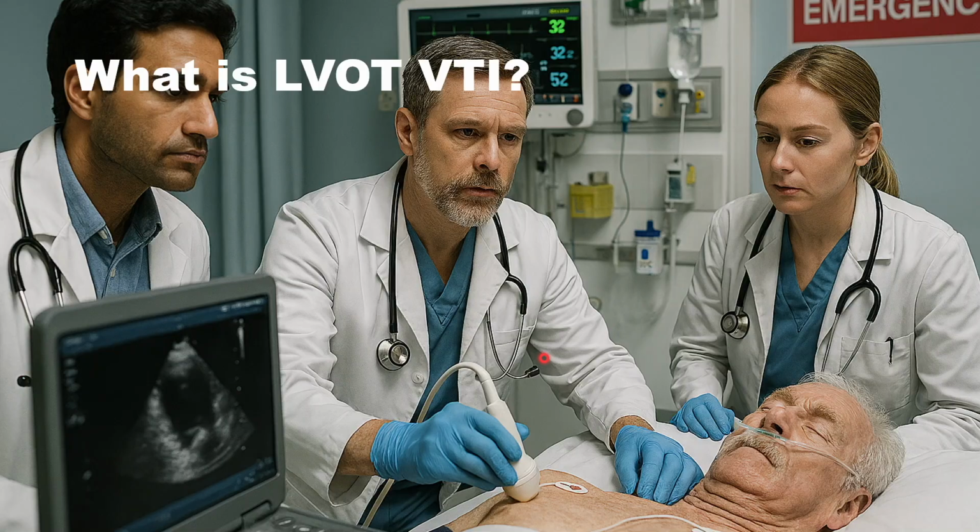So what is LVOT VTI? If you have watched my previous videos on this topic, I'm sure you are aware of it, and I'm sure that you are using LVOT VTI in your clinical practice already. So let's recap. Let's summarize the LVOT VTI.